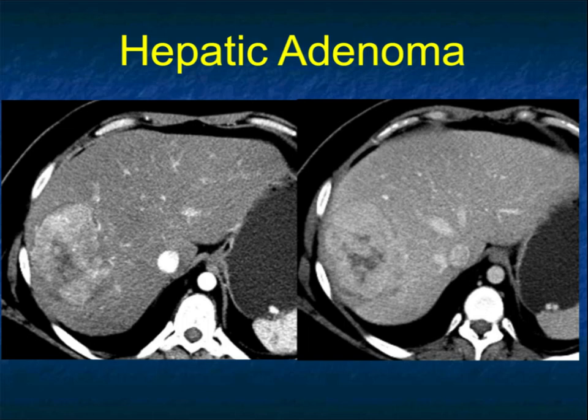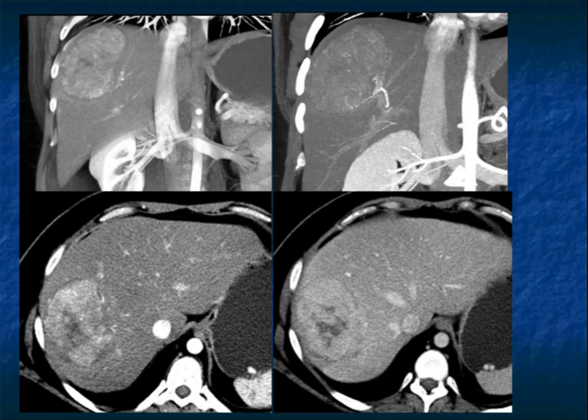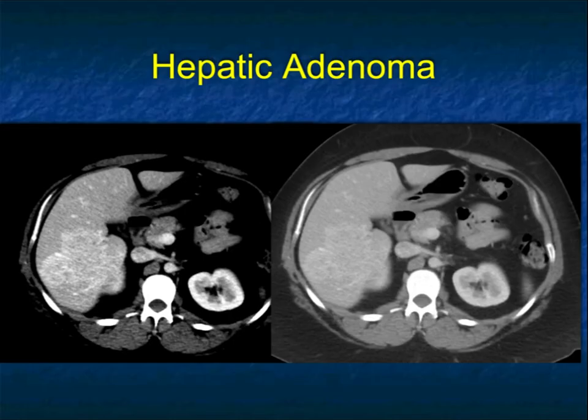Here's another example, very vascular, some central necrosis. Again, hepatoma is on my lips. This ended up being hepatic adenoma. Pseudocapsule, compressed adjacent tissue, stretching of vessels, and again, very nicely showing you how the lesion looks as you go from arterial to venous. Central scarring occurs in many different lesions. With hepatic adenoma, it typically does not fill in.